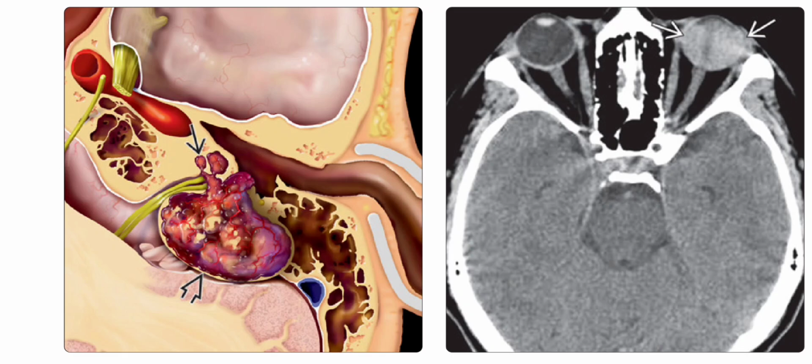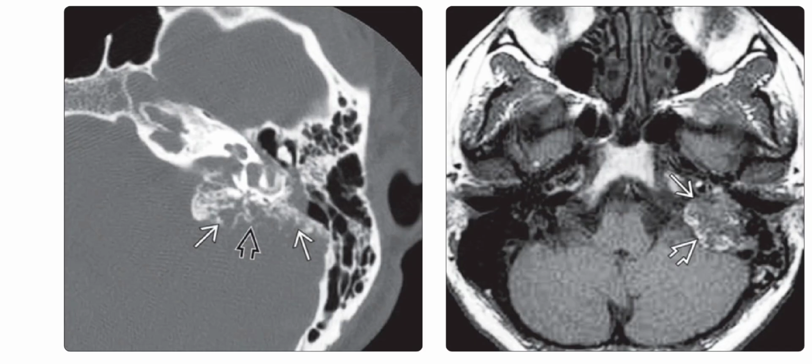And it shows a classic feature of VHL, a hyperdense V-shaped hemorrhagic retinal detachment, which is caused by an underlying retinal hemangioblastoma or angioma. Left is the temporal bone CT scan in the same patient, and it shows a lytic infiltrative lesion along the left posterior petrous temporal bone. Note the preserved spicules of bone within this lesion. Location and appearance is quite characteristic for endolymphatic sac tumor.